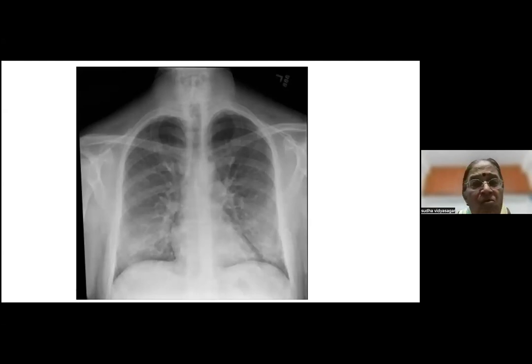Okay, what is that now? What does this X-ray show? Lower lobe pneumonia. You're all calling this pneumonia. Yeah, likely pneumonia. Mass, not a mass. Anything else is there? Apart from the pneumonia that you're calling, anything else is there? Okay, right. Somebody got it, isn't it?